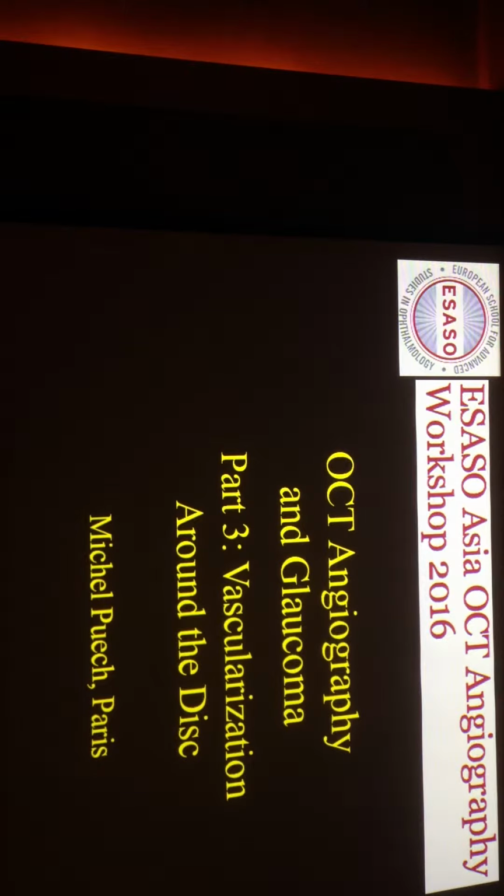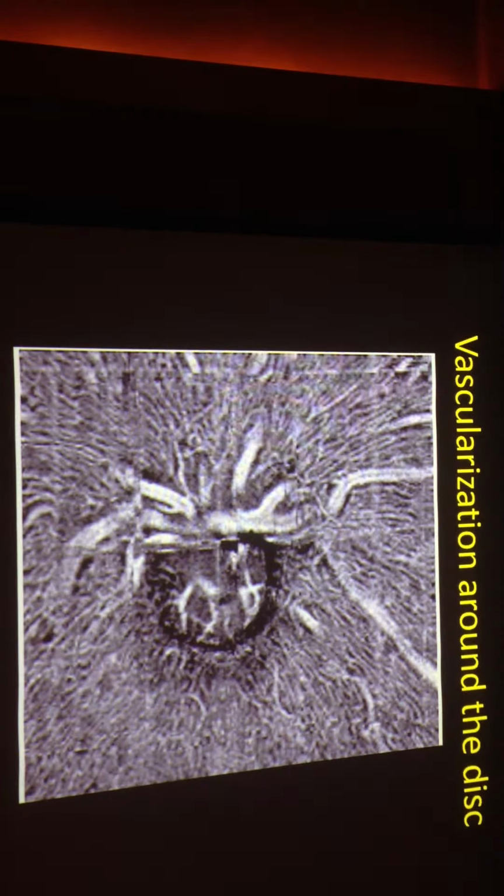Probably fluorescein angiography has not shown these vessels, and when we practice fluorescein angiography, we contact all the different layers of the retina, so you can have a level of gray in the images, but we are not able to detect this little vascular layer like we can see there. And with a correct segmentation just on the RNFL layers, you can see all this continuous network around the disc. It was a real discovery when we saw this kind of images.